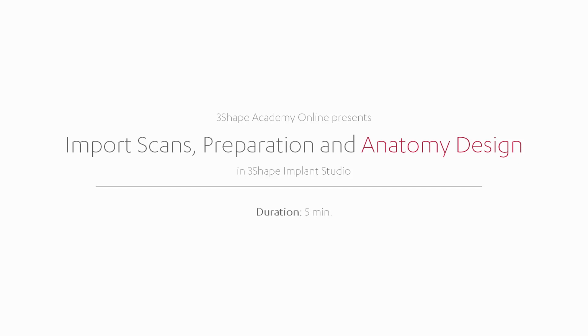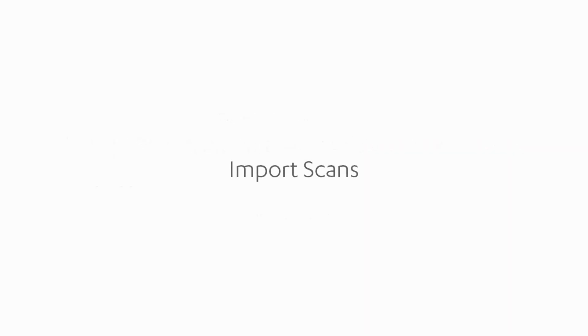In this video, you will learn how to import scans, prepare scans by virtually removing teeth, and also how to design virtual crowns for prosthetic-driven implant planning in Implant Studio.